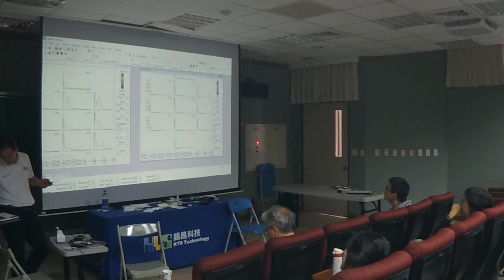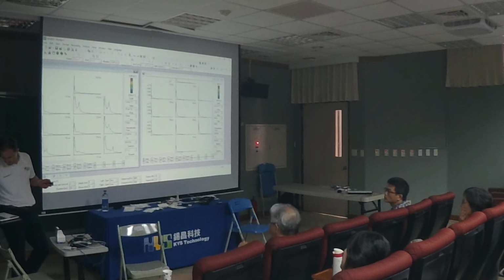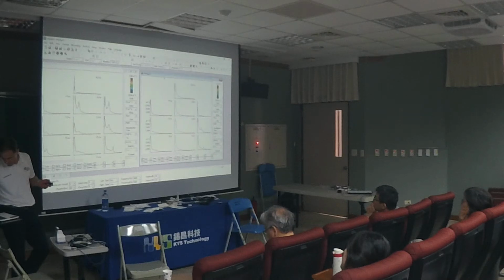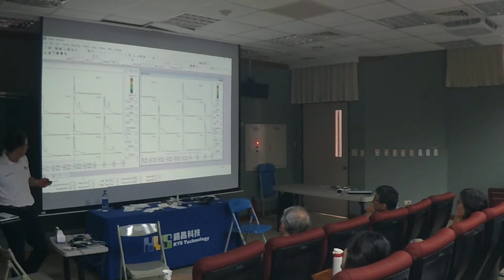So look at the first one. That's F3. Look at FZ.